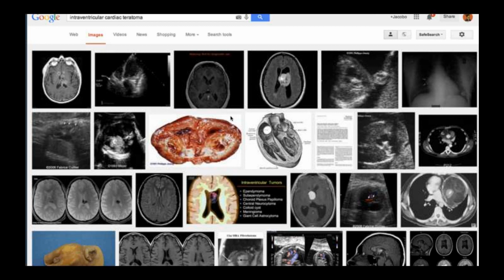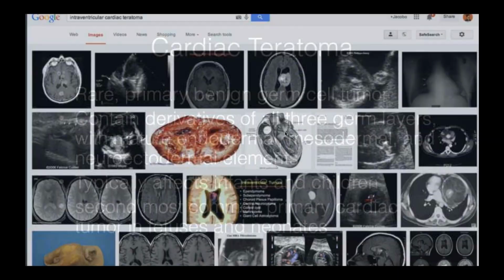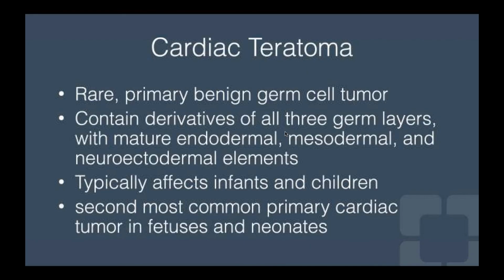So again, SFP, T1, fat sat, some T2, black blood T2s. This is the early enhancement ones. And then your PSIRs, your phase sensitive inversion recovery or late gadolinium enhancement images. All right, so this is another view of that PSIR in the short axis.